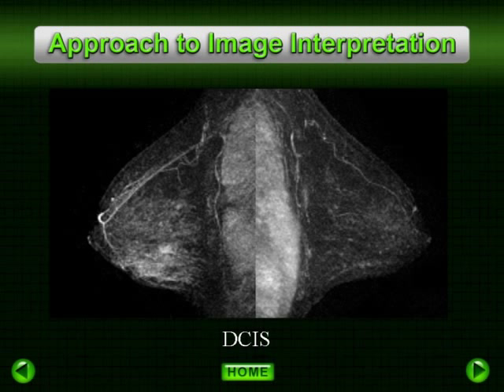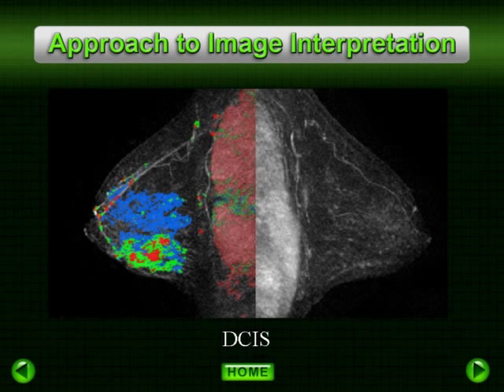Now when comparing the left breast and simultaneously evaluating the 1-minute subtraction image, you can see this has pronounced significance as it is markedly asymmetric. Color parametric mapping demonstrates abnormal regional enhancement kinetics inferiorly in the right breast. This was ductal carcinoma in situ. It is critical to simultaneously evaluate the breast bilaterally at the 1-minute post-contrast phase of imaging to make this diagnosis.